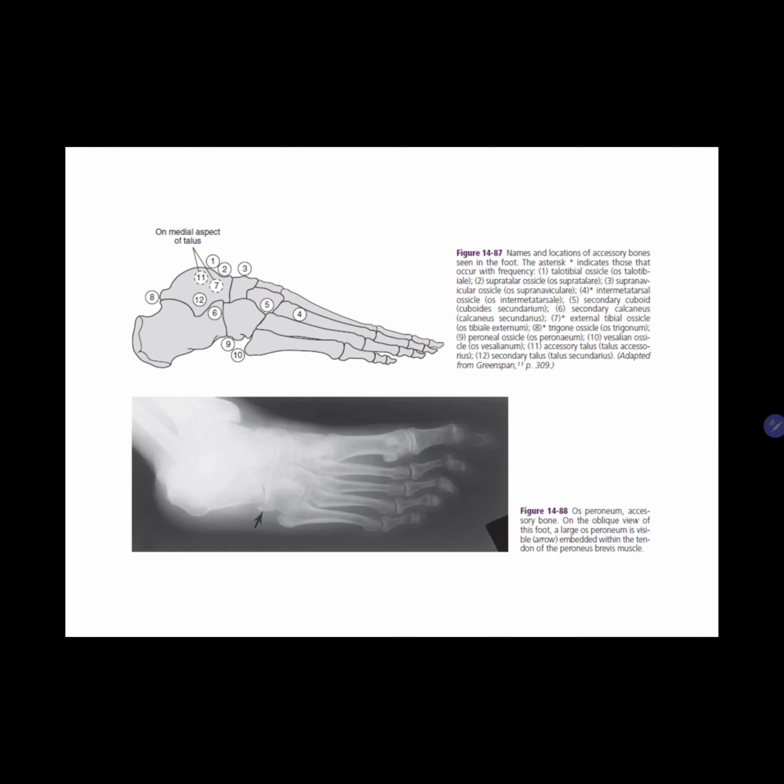Okay, so accessory bones can complicate the evaluation of foot injuries if they are present in the areas of suspected fractures, and comparison films are not always helpful because accessory and sesamoid bones are not always bilaterally symmetrical. In general, accessory bones are differentiated from acute fractures by the presence of an intact, smooth cortical shell with an underlying line of increased density. In contrast, acute fractures will have an irregular cortical surface and no appearance of increased density beneath the surfaces.